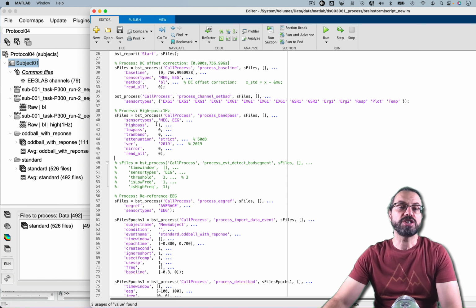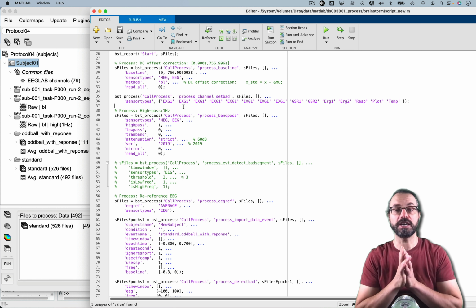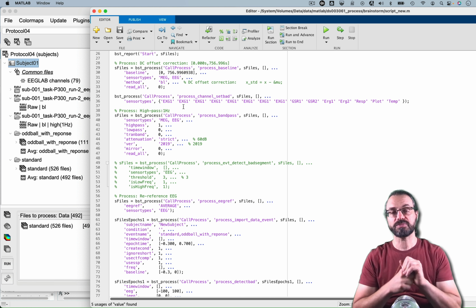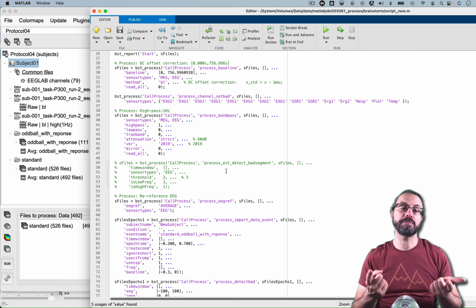As I did here in the channel editor. So it's the same as using the channel editor. The alignment of the channel location file with the MRI, I'm sure it's possible to do from the command line, but I didn't try, mostly because there's lots of manual entries. And so I thought I would have to plug in numbers, and also I don't need that for my pipeline.